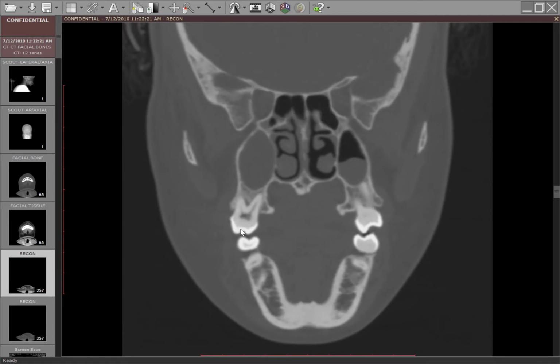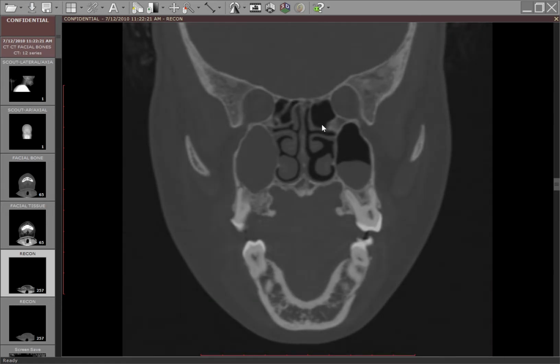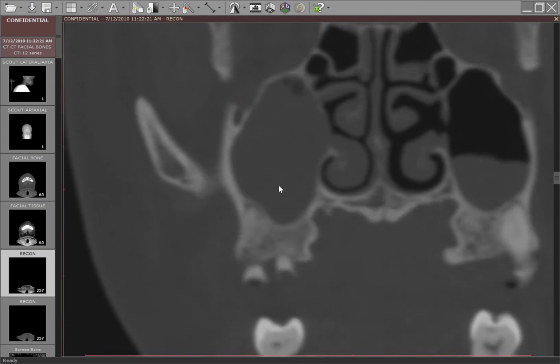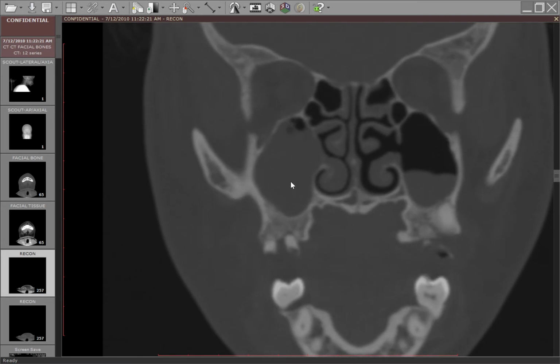So what about this tooth? You've got little periapical radiolucencies around the root. Let me window this, let me blow it up as well. There's also the suggestion of cortical dehiscence at the floor of the sinus. So that's pretty important, because I told you the infection, the inflammation goes where the cortical dehiscence goes. So what is this suggesting? Maybe this maxillary bacterial sinusitis is from the tooth infection. That's not a slam dunk case.